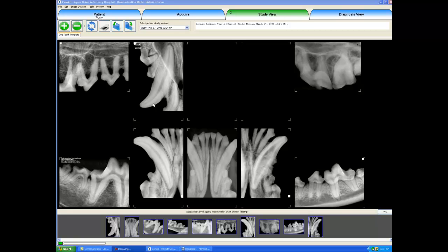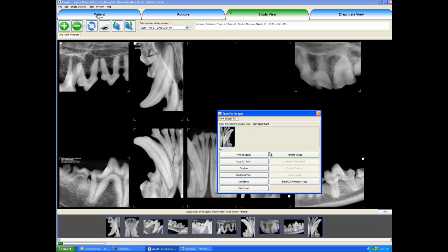Hello, I am Mark Thatcher, and I will be reviewing the right-click function in ViewAll. When I right-click on an image, a little submenu comes up with a few options. I will click on the Send Image menu, and it will show us different places where we can send this one image to. I could send it to a printer if I wanted to print it.